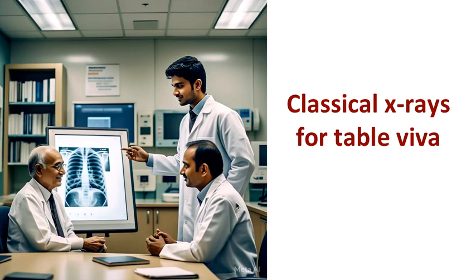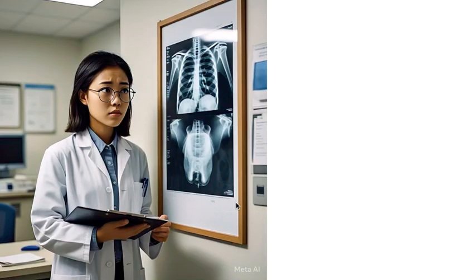Now, in table viva we show you multiple X-rays, and a student is expected to answer what he is seeing on those X-rays and give his interpretation. Even though you know the approach, that you have to look for AP view, PA view, the degree of penetration, the degree of rotation, it's a totally different ball game when you are appearing in viva, right? So you don't have to be nervous when you are interpreting a chest X-ray.